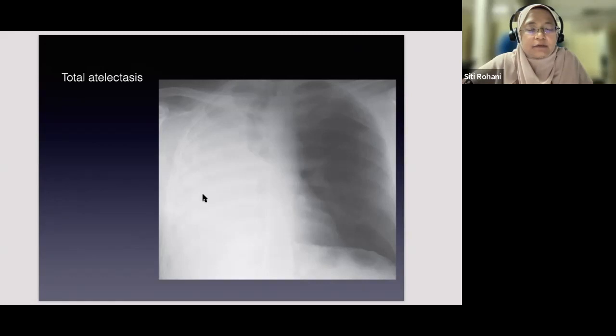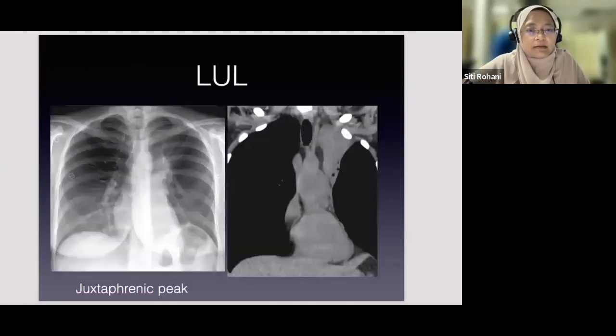In case of effusion, if this is a very large effusion, something voluminous, there's fluid in the pleura, it should give mass effect to the mediastinal structures. So the trachea should be shifted to the contralateral side, and the mediastinum should be shifted to the contralateral side. But in this case, we can see there's a shifting of the mediastinal structures to the ipsilateral side. So we know that this is volume loss. This is due to total collapse of the right lung.